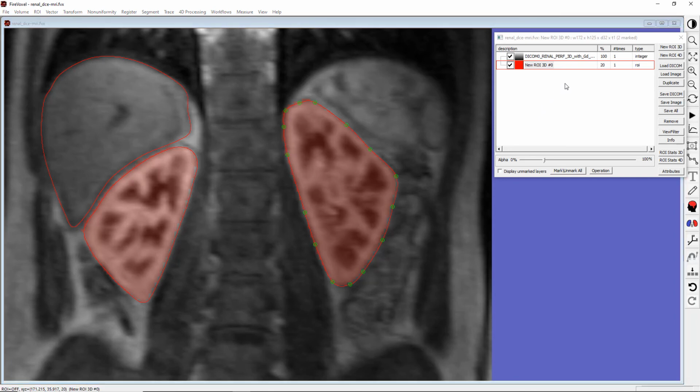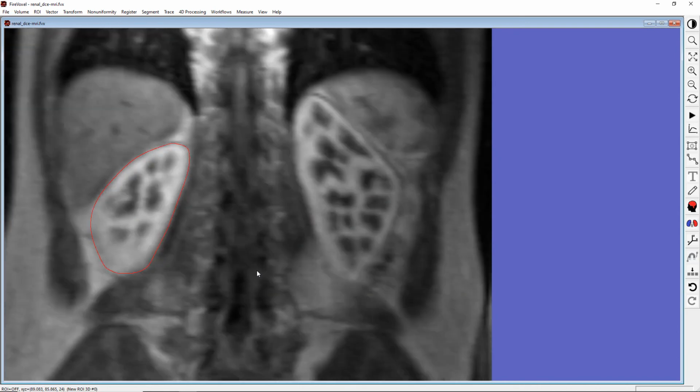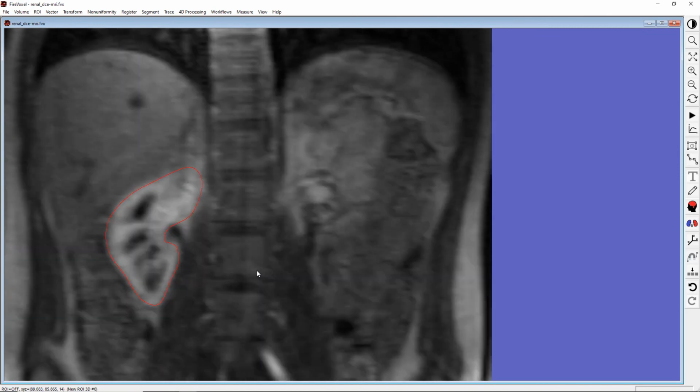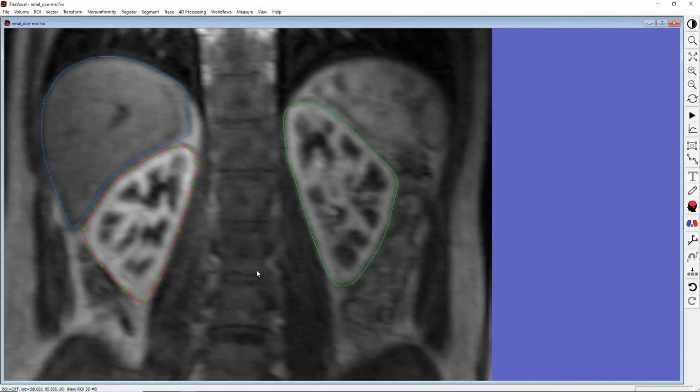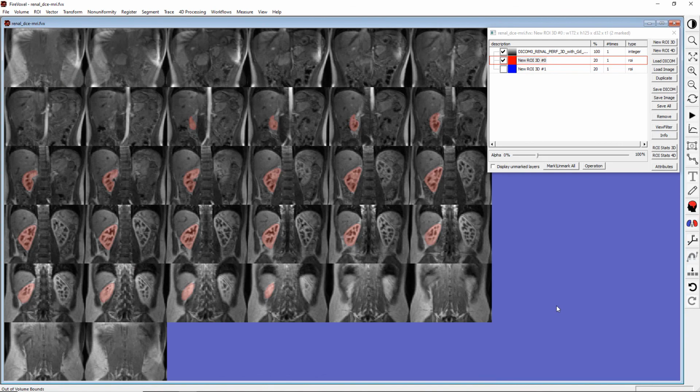To place a rasterized contour into a different layer, create a new layer. Select the contour, and again use the Rasterize command. To segment an organ in 3 dimensions using vector contours, you can draw a contour around the organ. Replicate this contour on all slices that contain the organ using Copy and Snap operation. Adjust the contours manually and rasterize these contours with the output to the same ROI layer. The resulting raster ROI will be a 3-dimensional segmentation mask of the organ.